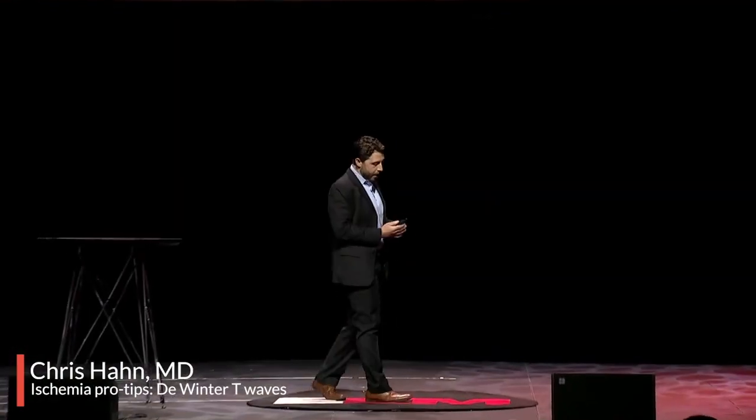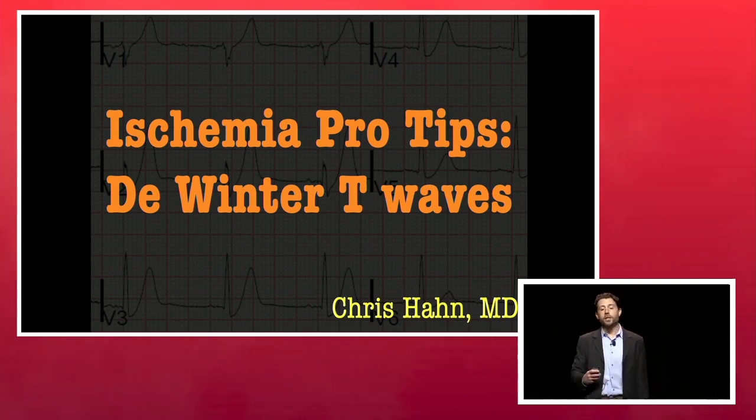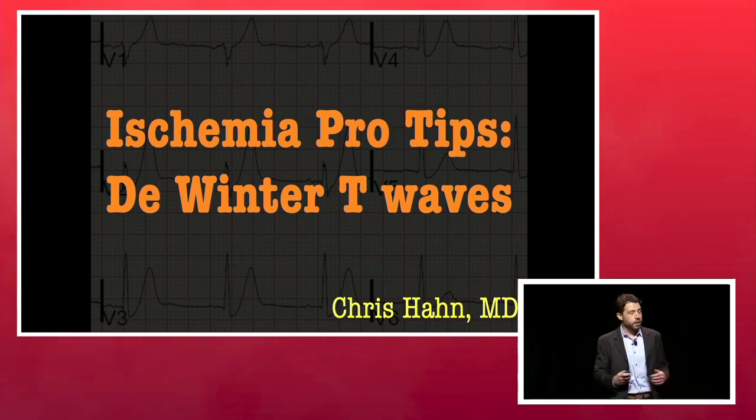All right, no hot sauce in this talk, but hopefully the teaching points will be fire. We'll see. This is the next eponym of ischemia, the de Winter T waves, which hopefully are review for many of you, but if not, let's all just get on the same page.